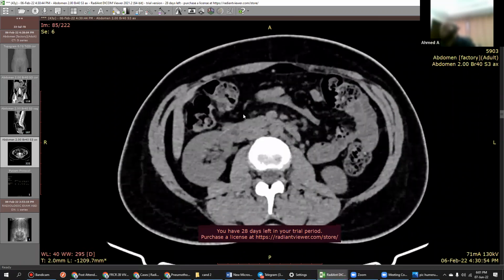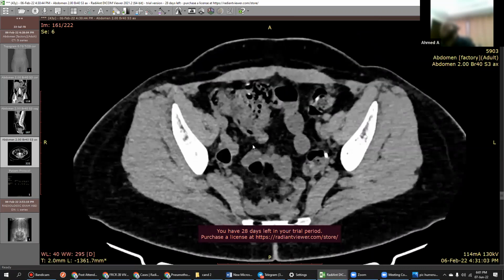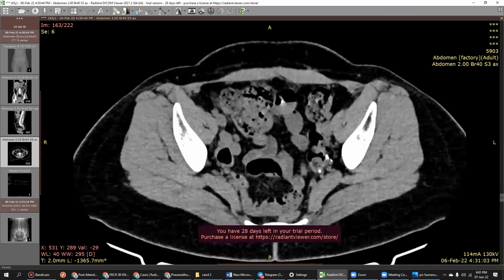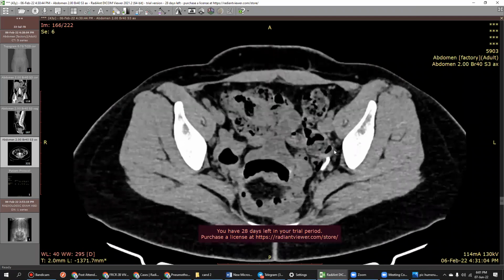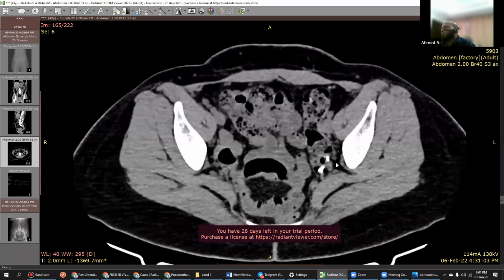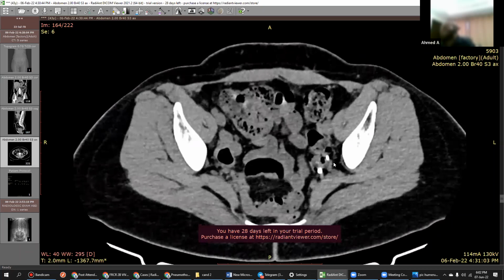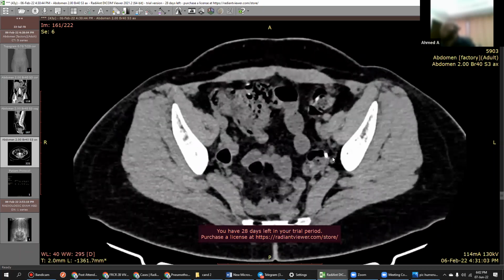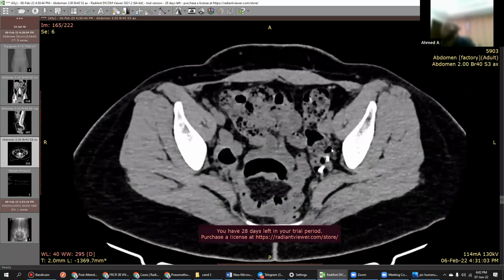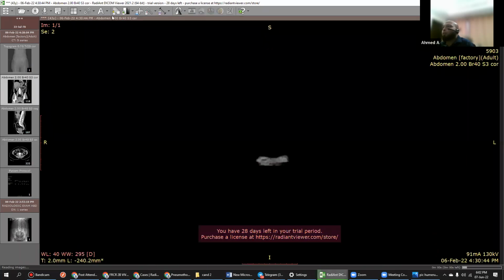For us also, the patient had just come for abdominal pain. Ultrasound was normal. Then we did CT. Then we found this. Understood? You can see this? Oh, I ignored this. Yeah, that's why. When the examiner is pointing to a very specific thing, just look at that site. Because there was no adhesion formation or obstruction and all, it was very easy to miss. So this patient had to undergo lap to remove this. Open surgery rather, not even lap.